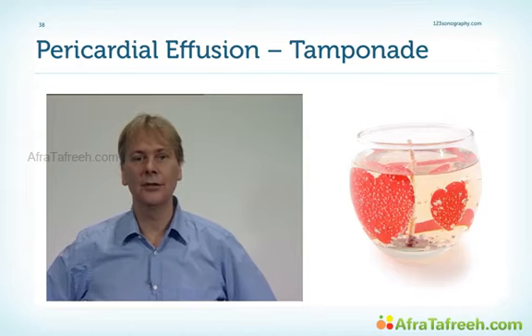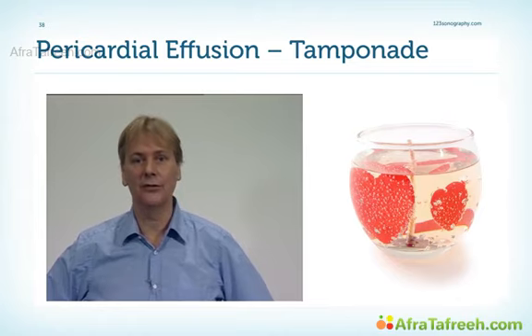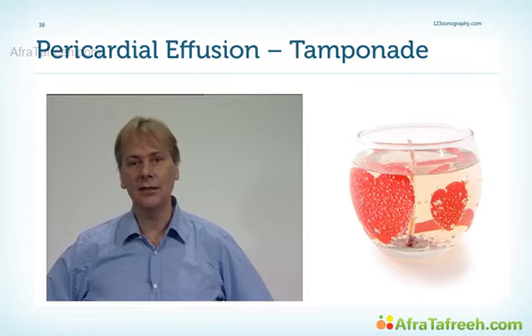To summarize this chapter, here's a short checklist for how you can go about it if a patient is referred to your lab with the question of tamponade and he has pericardial effusion. Well, the first thing that is very important, always look at the patient. If he has symptoms of cardiogenic shock, well, then you've already made the diagnosis. Then take a look at all the echo features we discussed in this chapter, especially the septal shift and also the fluctuations in the Doppler inflow signal across the mitral valve. Remember that many patients have subclinical forms of tamponade. These patients have to be followed up.